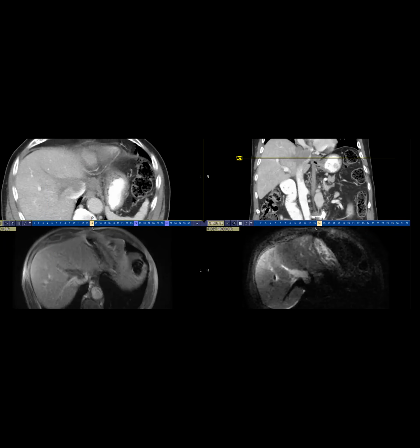Okay, so this is more in the line of liver masses and liver tumors. So in this patient, actually a 78-year-old male patient who, on I think cardiac echo, had decreased venous return, and basically they were just scanning and screening also for abdominal pain. So they did this CT scan of the abdomen, and you notice here, on the axial, it looks like a filling defect in the hepatic veins and IVC, which could have been a mixing artifact. But if you look here on the coronal, it looks very real and mass-like.